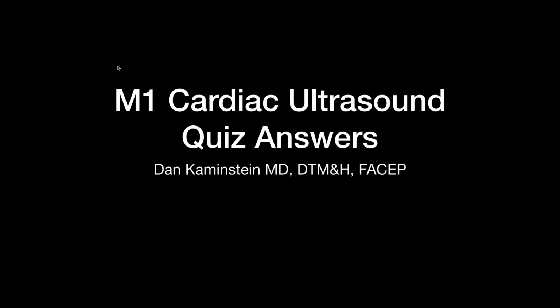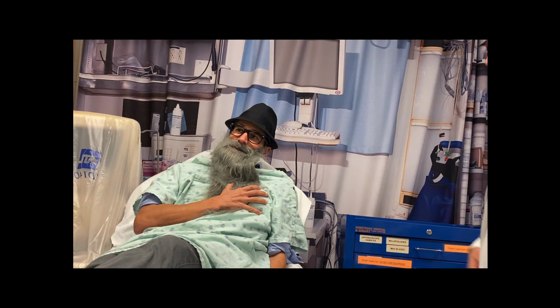This is a review of the answers to the cardiac ultrasound quiz. As you remember, we had Mr. Brokestone who came in with some chest pain. And during the ultrasound lab, we talked about some of the differential diagnoses that you would be worried about with his presentation. So the quiz questions really asked you to use the ultrasound images you obtained to think anatomically about how you would start to evaluate some of the differential diagnoses that you came up with during class.